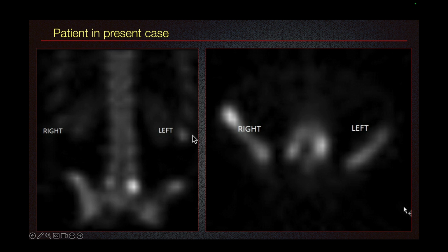Patient also had a SPECT scan. We see radiotracer uptake bilaterally, more on the left, and the left uptake corresponds to the fracture, but we did not see a fracture on the right. But the patient still has injury on the right side. So SPECT is more sensitive than CT for fractures. However, we lack the anatomic detail that we see on CT. So while SPECT is more sensitive, we lack the anatomic detail. So it's pretty uncommon for people to do SPECT CT for suspected cases for fractures. CT and MRI are a lot more common.